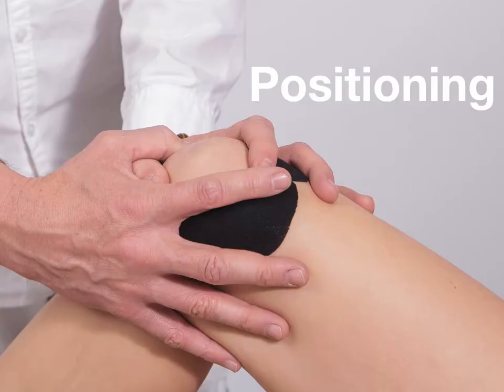The next concept I want to talk about is patient positioning. This will really vary significantly based on the body part being examined. However, it is important to make sure that the patient is comfortable and that you're supporting the extremity being examined to avoid unnecessary movement and artifact. If a joint or tendon is involved, positioning should ensure that dynamic examination is possible.